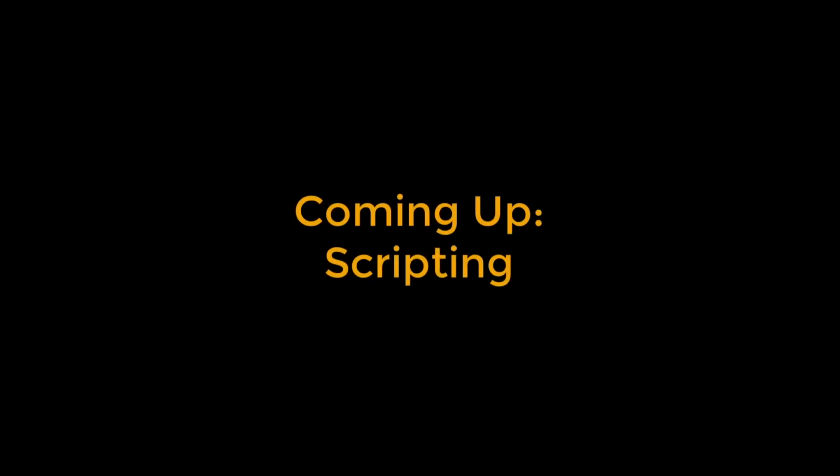When you have finished running the preprocessing and the first level analysis, we will then need to run this for each subject in our study. To speed up the process, we will learn about scripting, to which we now turn.